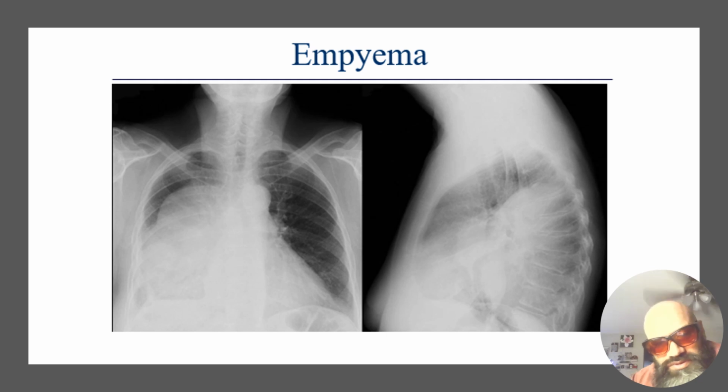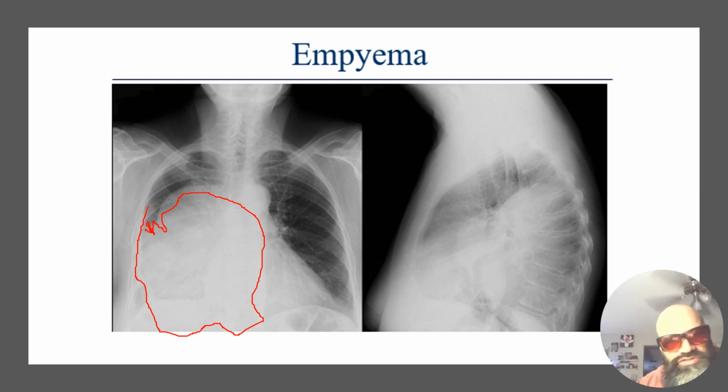So here's what one looks like here. So we have this entire area of fluid consolidation. It looks like a pleural effusion with thickened material. So here is a view of it as well.